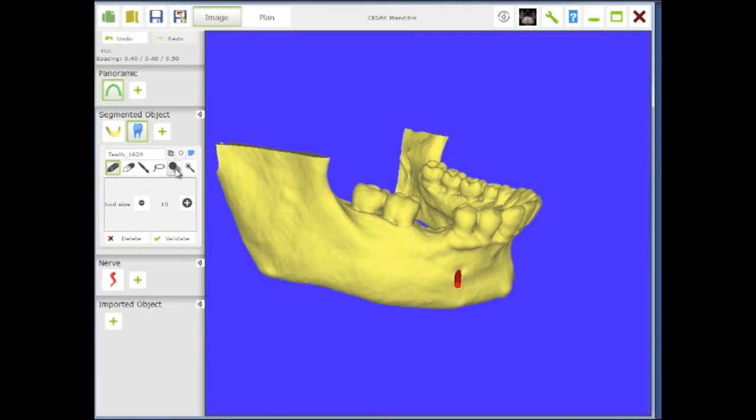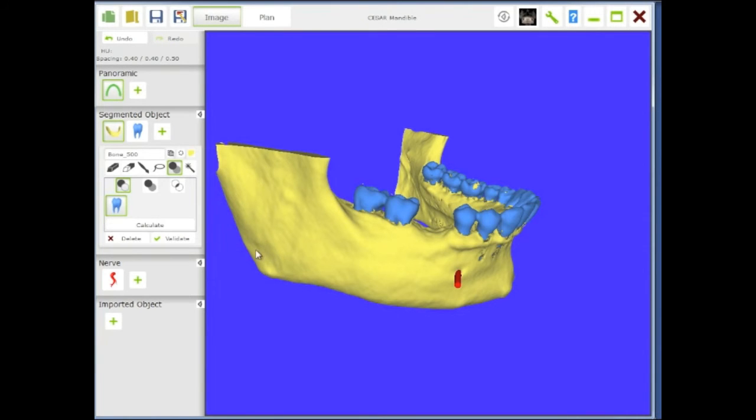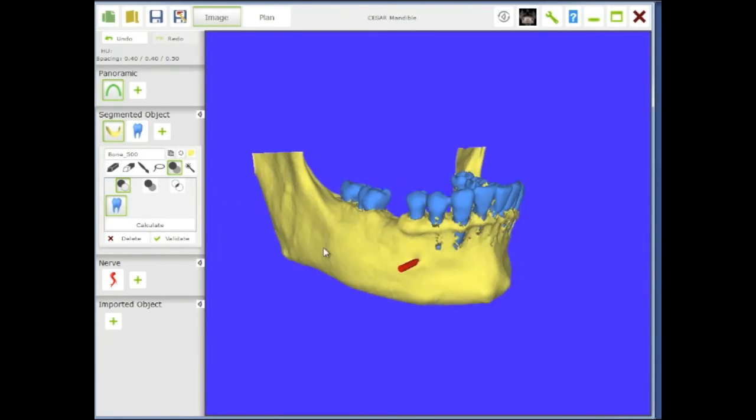So now we're going to use a Boolean tool, and this Boolean tool will allow to go from the full mask minus what? We go from the full mask, first of all, minus the teeth, and we calculate. And this will give you the separate mask.